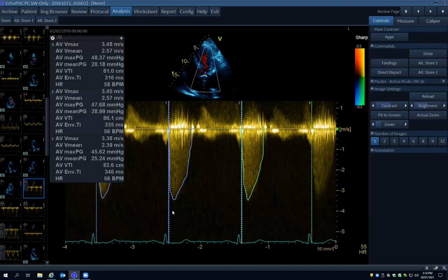Nice, absolutely. Adjusting your scale, and this is a principle we have in MR, whatever your velocity, you want to be maybe 20% above that velocity. So this dead space between the velocity of 4 to 5 is a scaling issue. And then when you draw your peak velocity and your curves, you're more likely to make an error. So try to explode that out so you get to see the peak as well as you can. Increase your gain so that you have, we talk about the chin and the beard, and here you only have a chin, no real fuzziness of the beard.